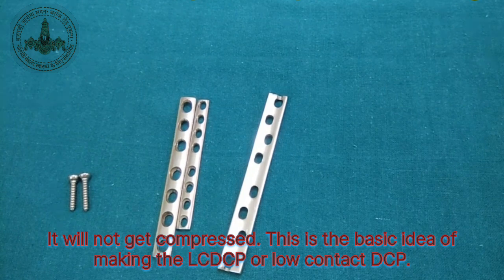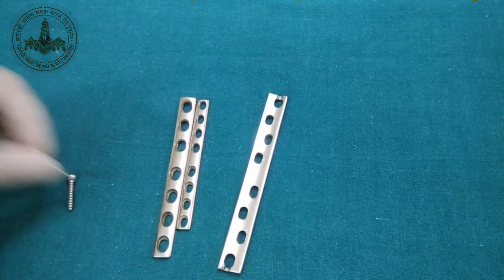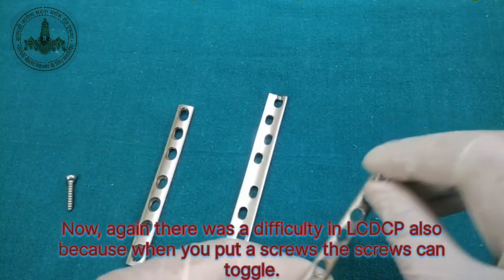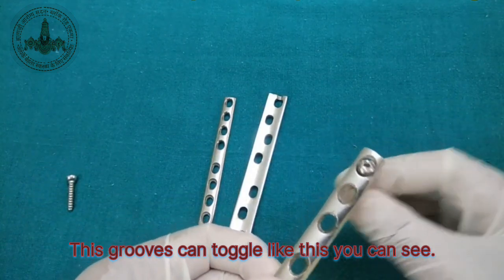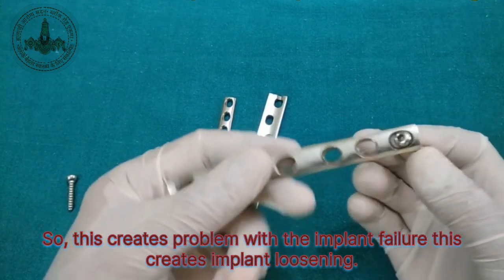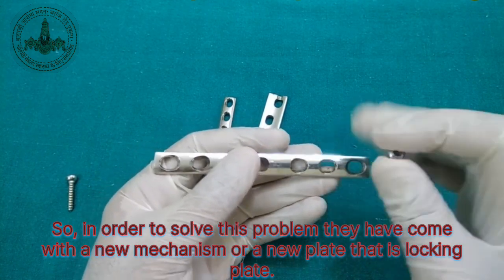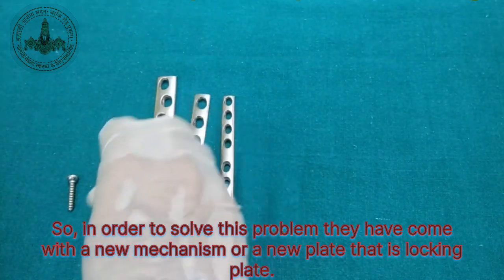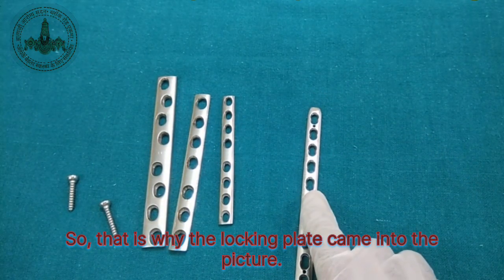Now again there was a difficulty in LCDCP also, because when you put screws, the screws can toggle. The screws can toggle like this, you can see. So this creates problems with implant failure, this creates implant loosening. So in order to solve this problem, they came up with a new mechanism, a new plate, that is the locking plate. So that's why the locking plate came into the picture.